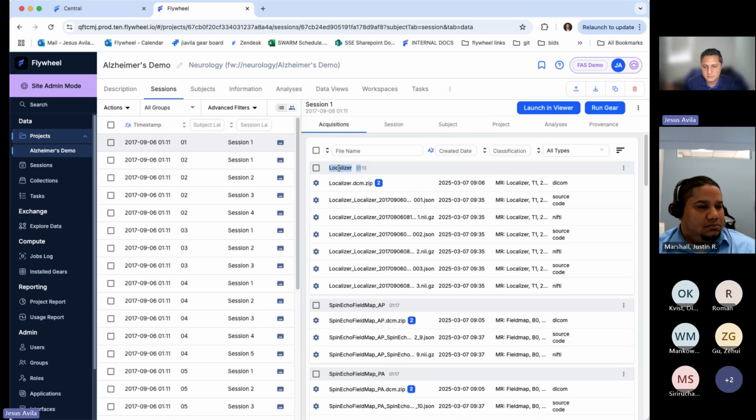It's kind of a weird thing that Flywheel does. But these right here are called labels in Flywheel, but you can just refer to them as names. The SDK, if you use the SDK, and you try to access what this is, then that's going to be known as a label. But at the file level, it's going to be known as the name.